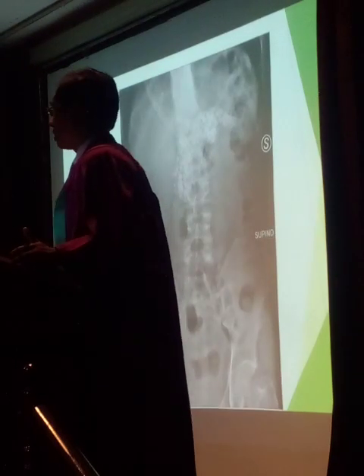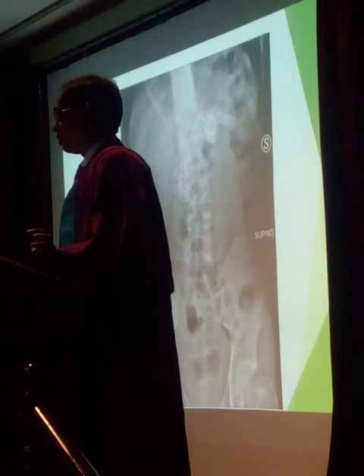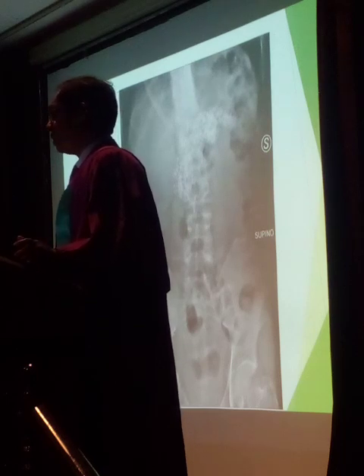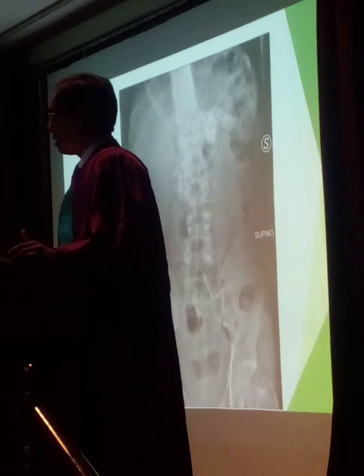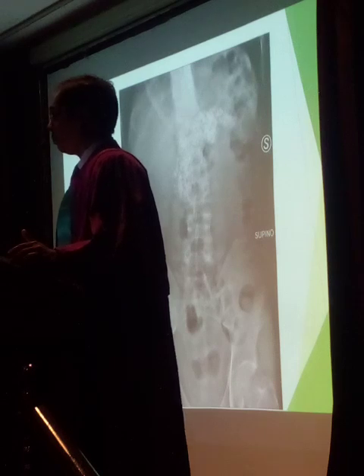This is not actually a pancreatic carcinoma, but diffuse pancreatic calcification, maybe with calcific pancreatitis or other conditions. As in this X-ray, we can see some calcification in the body and the head area in some pancreatic tumors.